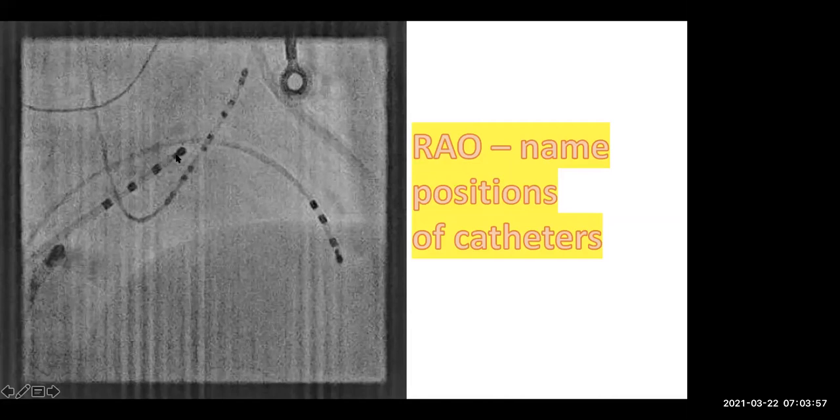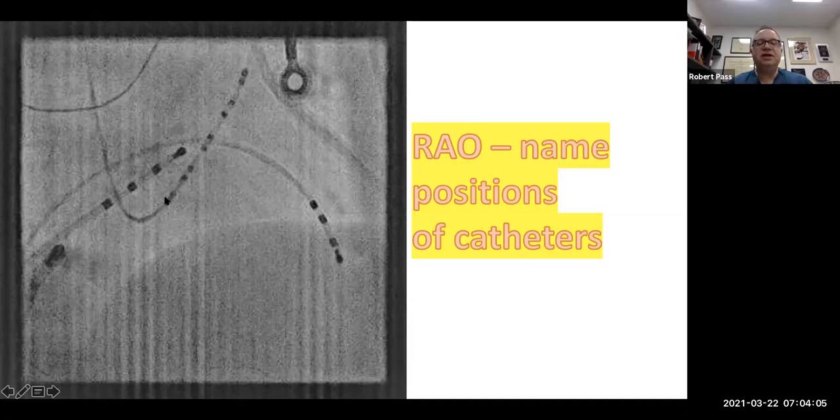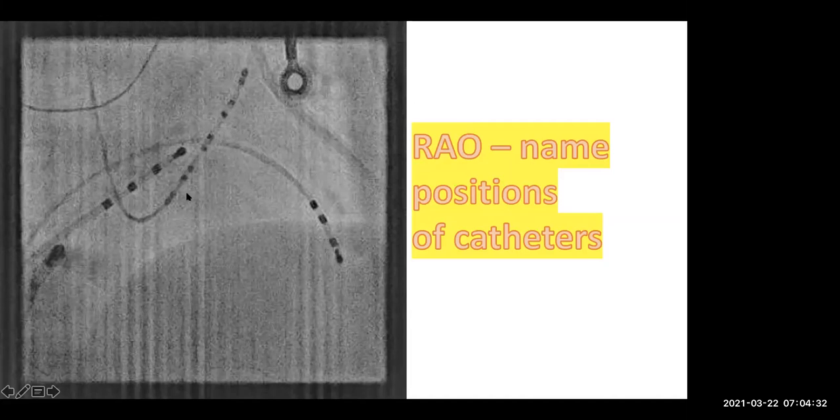And so the coronary sinus catheter is below. Sorry, on my sheet I'd put it as CS. The CS is below this always. In most cases, the coronary sinus with normal structural heart will be lower than the His, and of course, if we were looking at the LAO view, we would see that this is also posterior to the position of the His catheter. So this catheter seems very unlikely to be the His catheter, since it is obviously quite inferior to the level of the coronary sinus catheter.